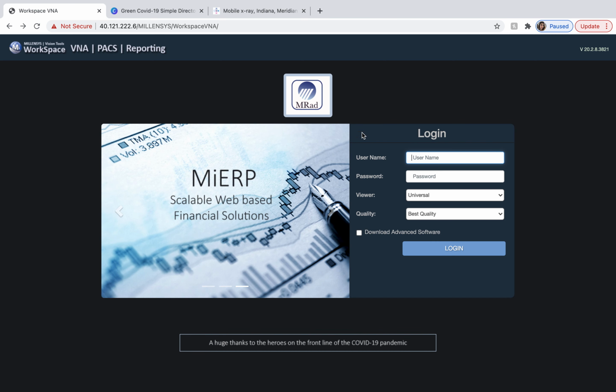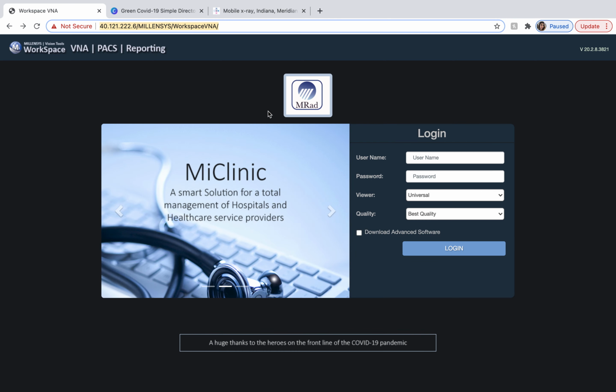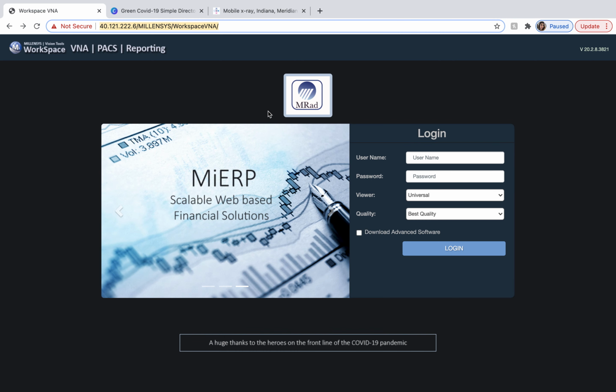The first thing you want to do is go to this website up here. I will put the link down below and I'll mention it again at the end of the video. When you first go to this, I recommend using Google Chrome. If you use Internet Explorer, it could have some glitches. Firefox usually works pretty good, but Google Chrome's best.